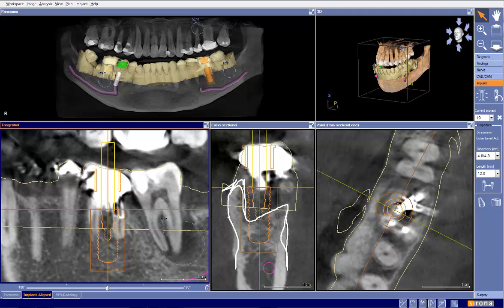If, for example, in theory, we were able to maintain all of this bone right here, then I would be a big proponent of going ahead, placing the implant, and grafting this wally defect, because we have walls on the mesial, distal, buccal, and lingual, so it becomes pretty straightforward. My concern is what's going to happen to this green area. I'm pretty positive we're going to lose this.